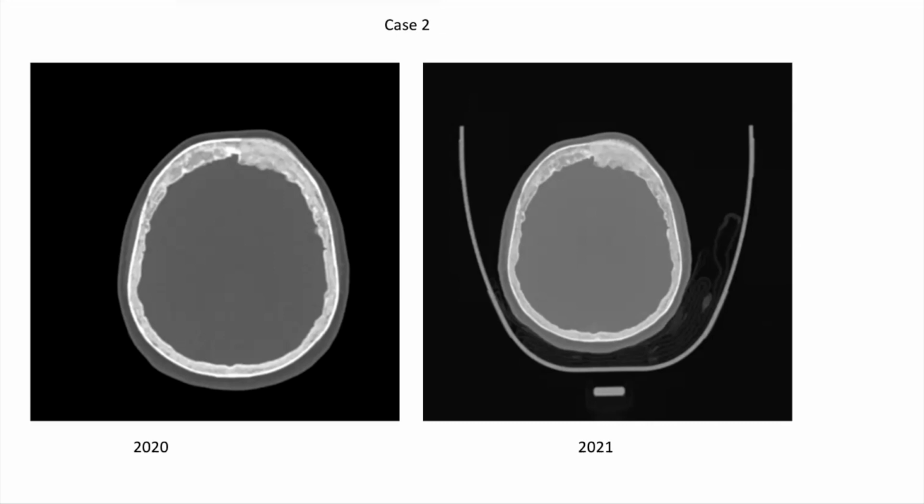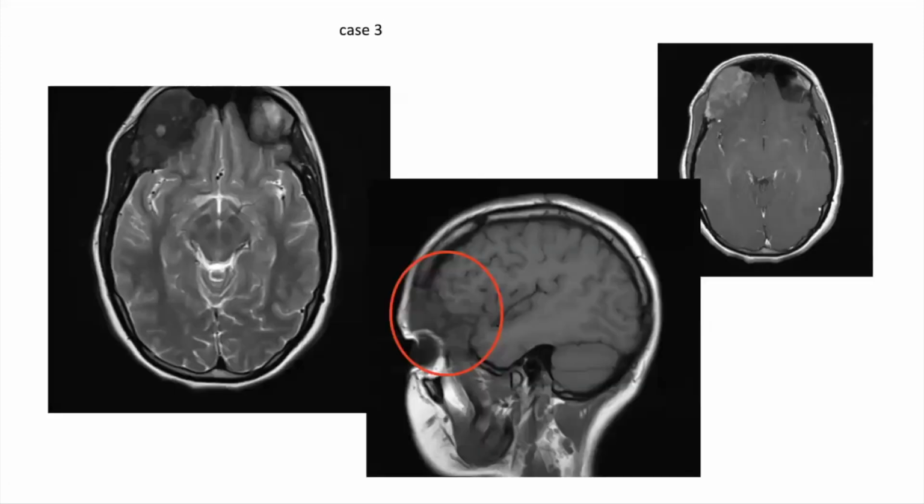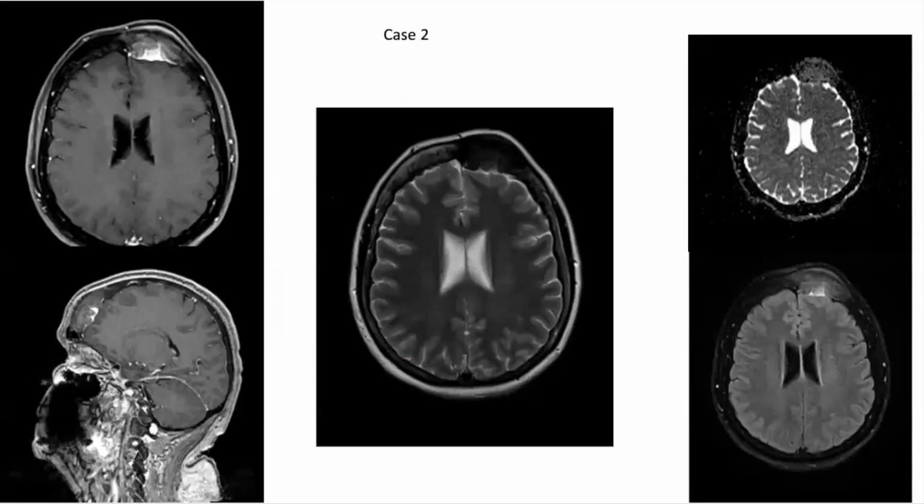Now, I know why you were thinking fibrous dysplasia, because I just told you that you see a ground glass appearance, and I agree. This has kind of a ground glass appearance to it. But again, I'm trying to show you all the imaging, and so this works the same way. When you see the CT scan, in this case, the CT was done first. In trying to characterize this lesion, going to the MR scan gives you a chance to make those additional observations that should lead you away from fibrous dysplasia.